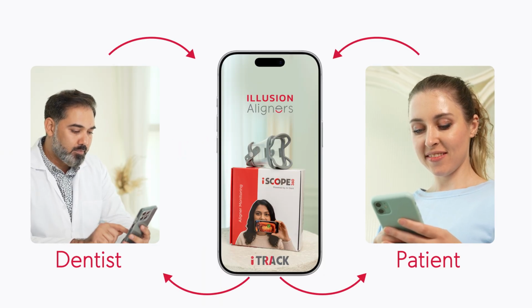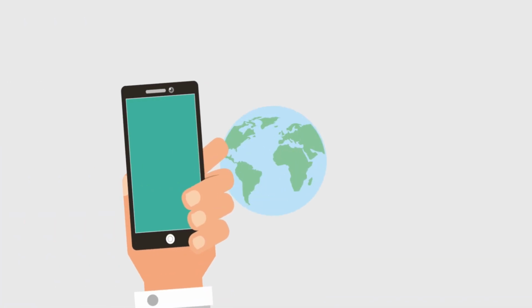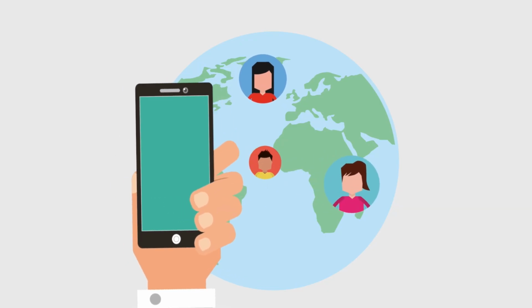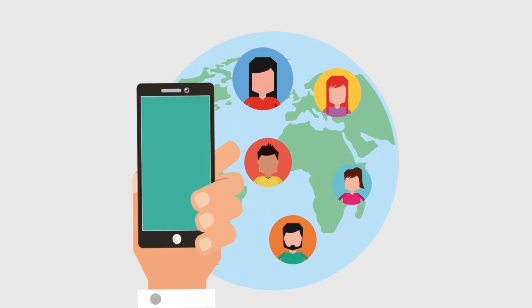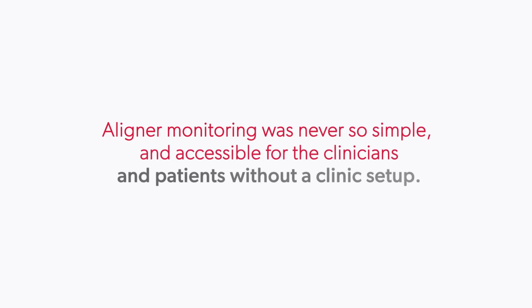With iTrack, aligner monitoring becomes structured, predictable, and effortless. Distance is no longer a barrier. Stay linked to every patient's journey at every step, no matter where they are. That's iTrack. Aligner monitoring was never so simple and accessible for the clinicians and patients without a clinic setup.